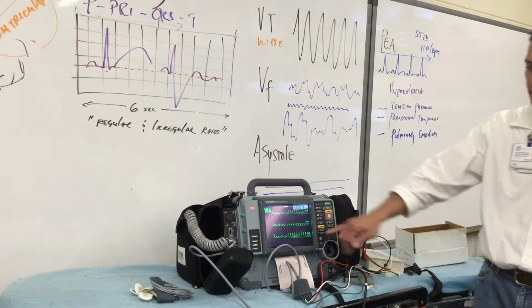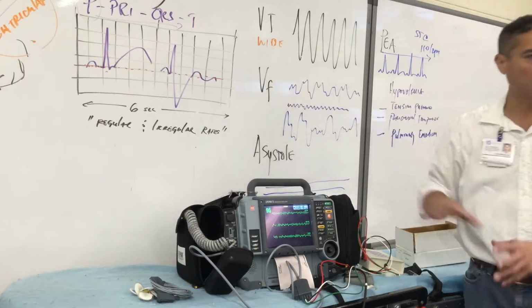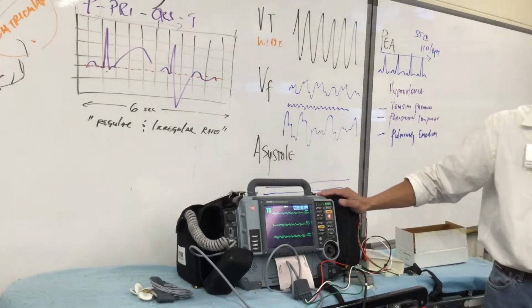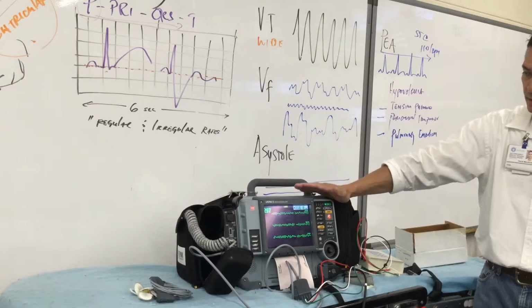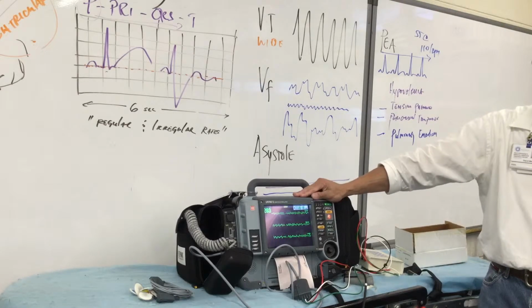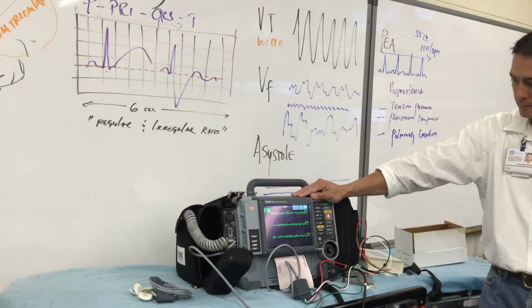As we mentioned, as the electrical activity continues, it gets less and less organized, and the patient may deteriorate down into what's called ventricular fibrillation. Again, when we're shocking the patient, we are trying to reset the electrical conduction system and pacemaker site. It's not trying to jumpstart them.